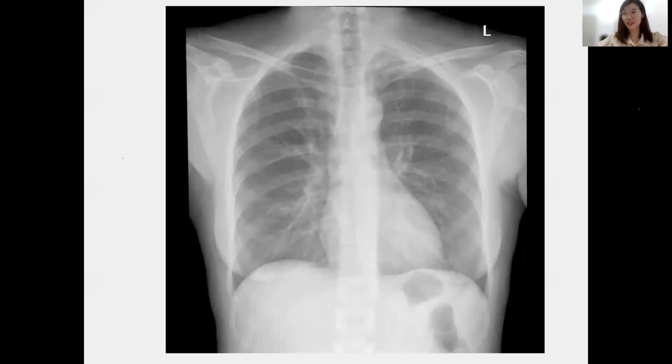Okay, so let's answer. If not, we cannot finish. So it's not normal. Ah, good. Somebody said left vertical opacity. Yeah, so you will see some high opacity here. So clever. Who is it? Dr. R. Yeah. Great job.